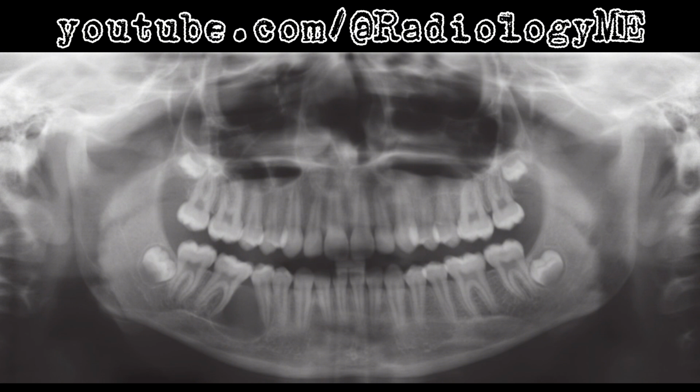The next step would be further imaging, potentially a CT scan, to evaluate the lesion's full extent and to confirm cortical thinning or expansion. This would help guide surgical planning, as complete enucleation and curettage are required to minimize recurrence, particularly for KCOTs. In an exam setting, you might be asked to differentiate between KCOT and ameloblastoma.